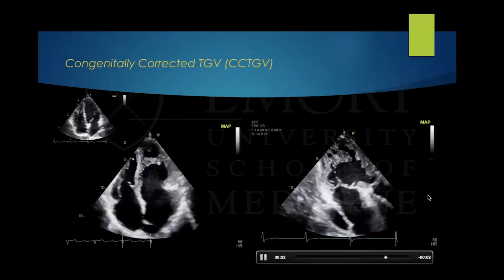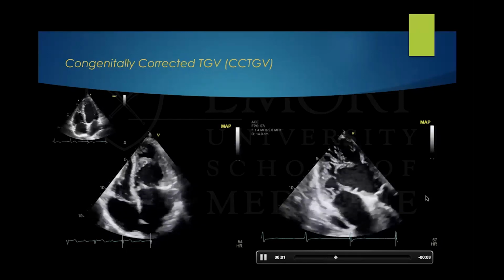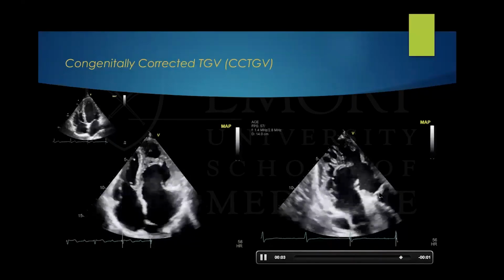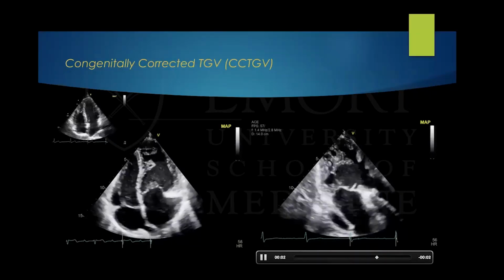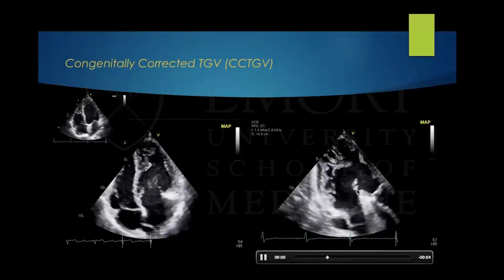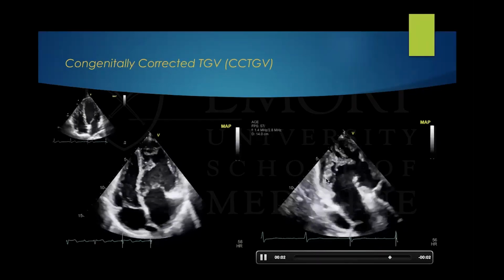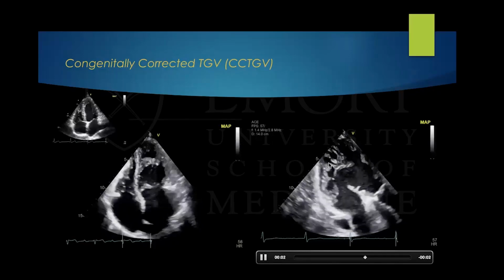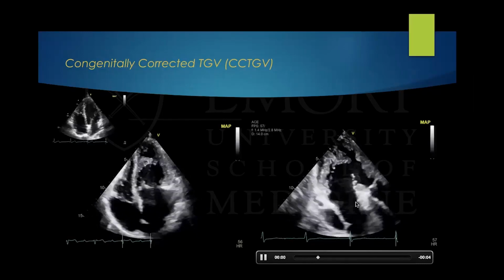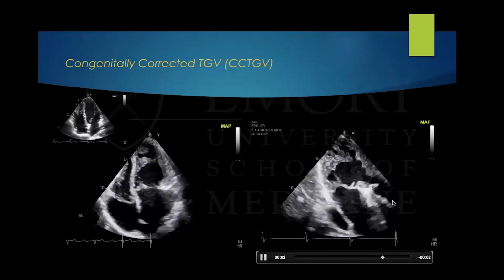In this 3-chamber view of the right ventricle, you can appreciate another feature of these morphologic right ventricles, that the AV valves don't have continuity with the great vessel, in this case, the aorta. There is the conal septum here. In a left ventricle, the AV valves will have continuity. So this is anatomically a right ventricle with a lot of heavy trabeculation because it's functioning as a systemic ventricle. And this is the left atrium. So left atrium, tricuspid valve, right ventricle, out to the aorta.